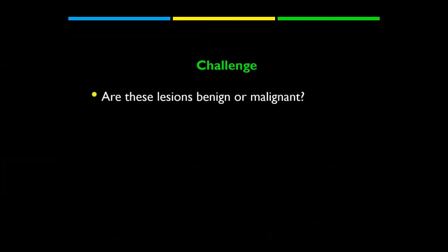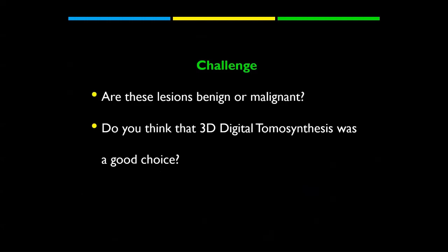Now, the challenge in this case, are these lesions benign or malignant? Do you think that 3D digital tomosynthesis was a good choice? And was MRI a good choice or not?